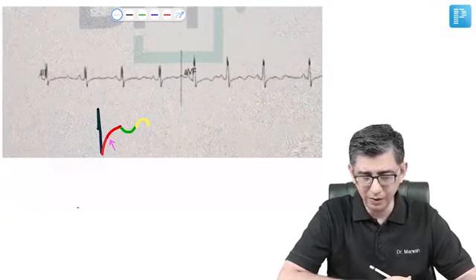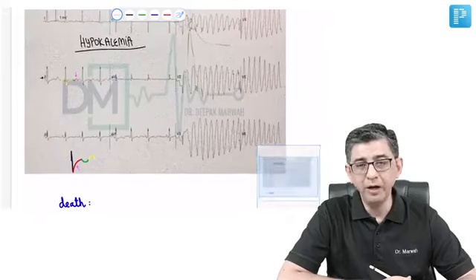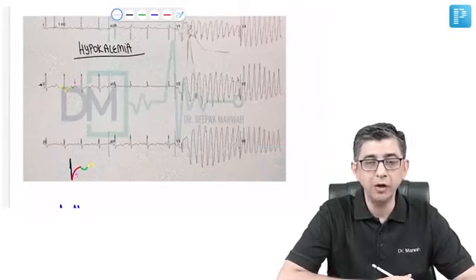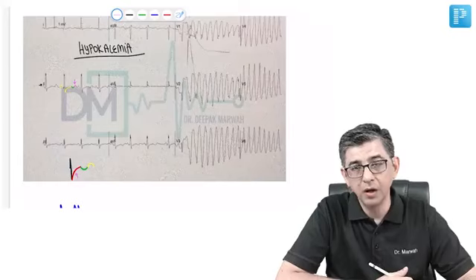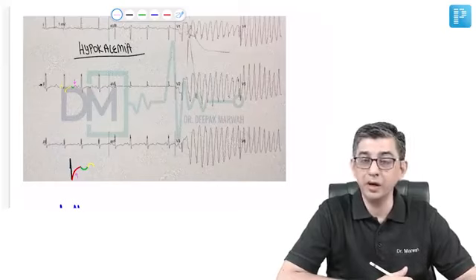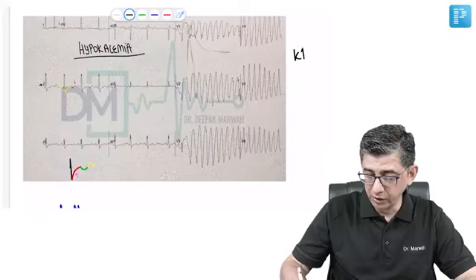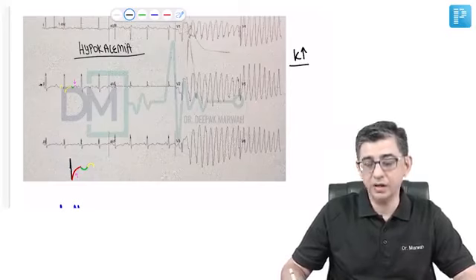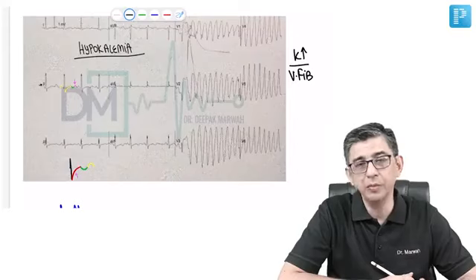And there is a possibility that in the exam it might be a little difficult for you to pick up. So I'm showing this ECG not because I wanted to pick up a prominent U wave, but rather an arrhythmia that can be seen with patients of hypokalemia. You see, when I was teaching you hyperkalemia, I was saying that there could be a diastolic arrest in a patient, or rarely in hyperkalemia, you might even have a ventricular fibrillation. I'll just put that on record. Hyperkalemia usually causes bradycardia. It finally causes a diastolic arrest in the patient.